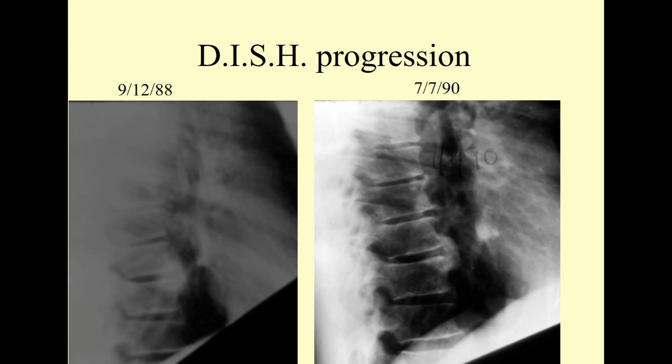Well, clearly here, at this stage, it looks like he's only got 2 vertebrae, and this is going to be interpreted as DJD. Now, in the thoracic spine, where we clearly are, as you see the ribs coursing across, this is actually pretty good disc spacing for thoracic vertebrae. But again, Forestier set the rule. He was the first to discover it. He got to set the rule.